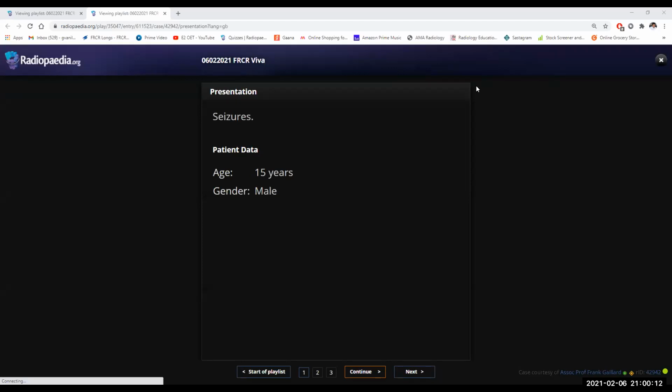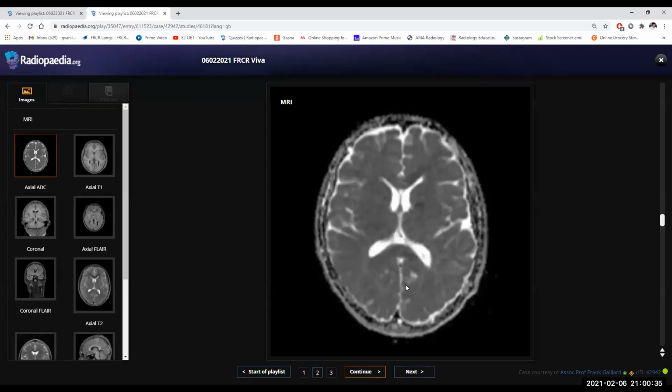Okay, let me stop the chatting. Yeah, go ahead. So this is seizures for a 15-year-old male. I should have the control. Do you want me to go to number 2 or will you do it? Yes, number 2. I would like to start with T2, if that's okay. Yes, any sequence you wish.